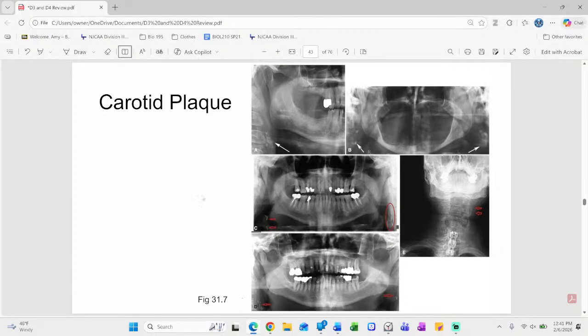That lets you good reference to go. They have many things circled here for you. Where does carotid plaque like to run? In front of the vertebra, which is why many times when the vertebrae are gone, I cannot assess for carotid plaque. So they're pointing here. This is carotid plaque. Also here, this has been a while, right? That it's had time to form in that vessel. Also here that they've circled in red, a little bit over here.